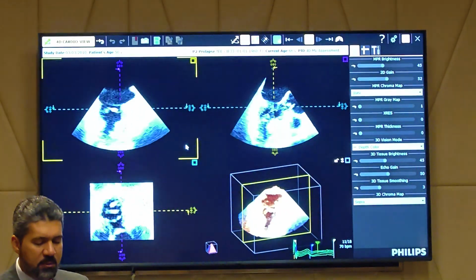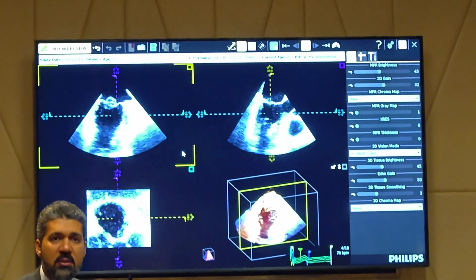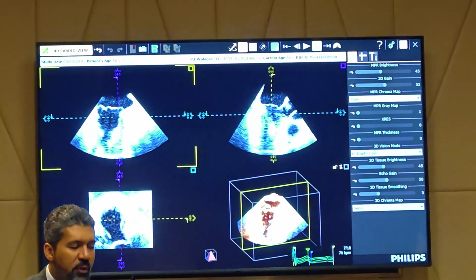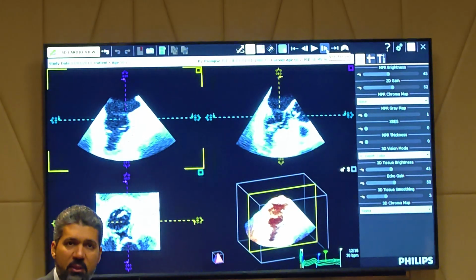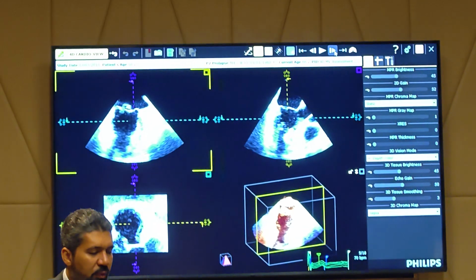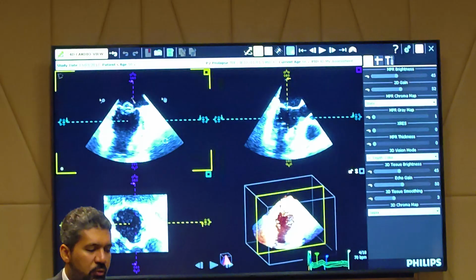Any MPR analysis has to start with the time, at which time you need to analyze the mitral valve. So, how to choose the time? I will pause, okay, and then move frame by frame to reach the suitable time I want. If I need to measure the annulus, for example, at the beginning, I need systole, so I will go frame by frame till the mitral valve closes, okay, and this is the highest prolapse. Okay, now I start to see this.